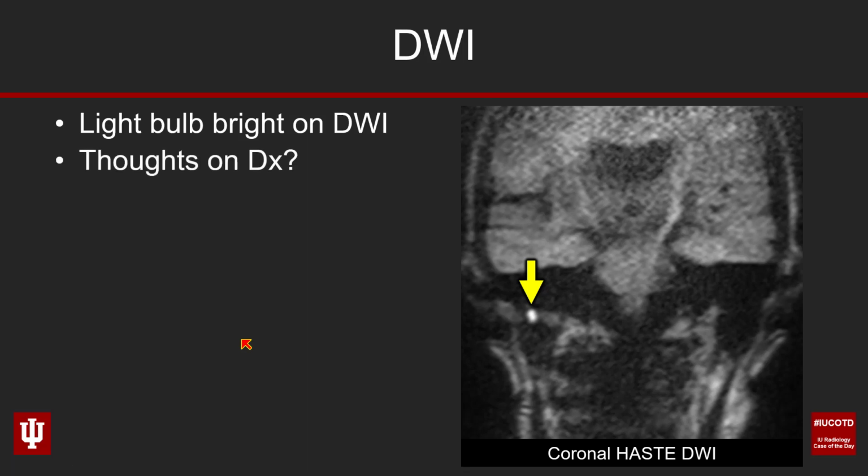Hopefully the general diagnosis here anyway should be readily apparent. But what's unique about the location, and when we see it here, is there anything else that needs to be fleshed out more in your report? Anything else that we want to report to the ordering docs?